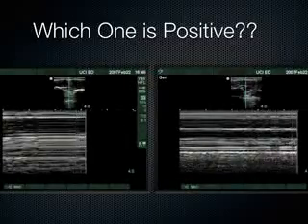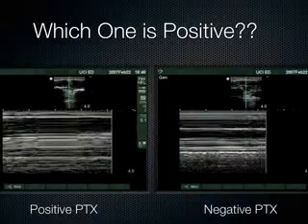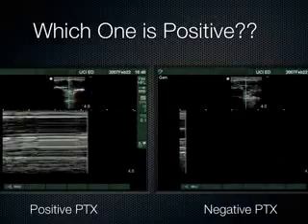And last example, which one is positive? Left. Nice job.